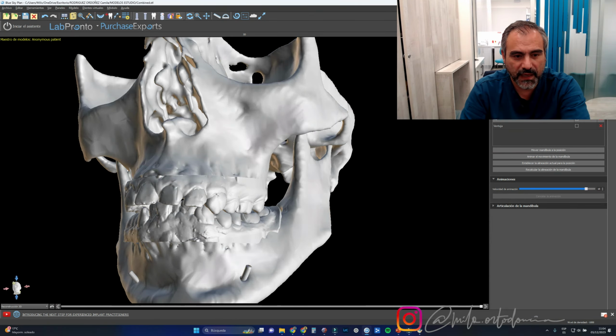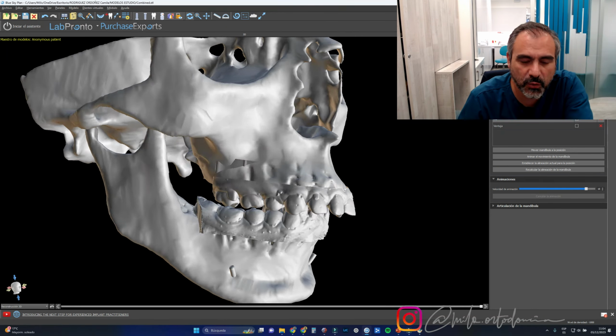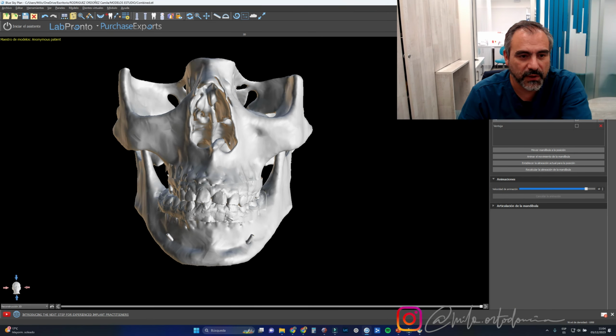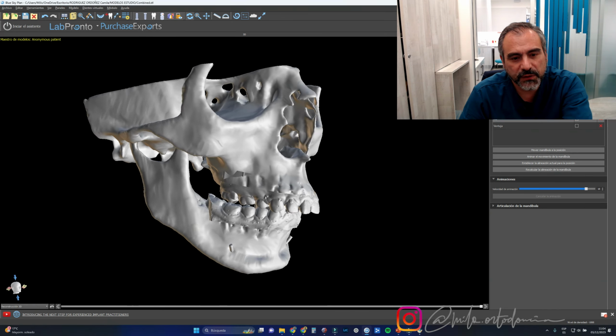We want a centered position of the condyle so that we can begin our treatment. This makes the case an obvious orthosurgical solution. For that, isn't it? Dr. Cristobal Quevedo has helped me to prepare just the surgery simulation. How are we facing this type of simulation nowadays?